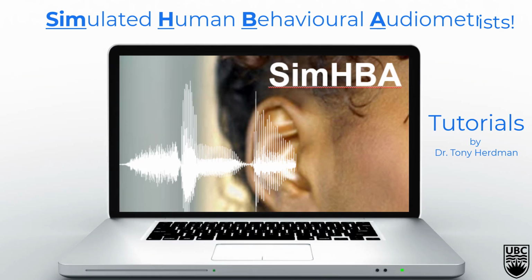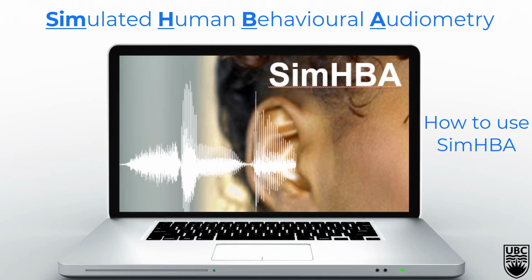Welcome to SimHBA, the Simulated Human Behavioral Audiometry software. In this tutorial, we're going to learn how to use SimHBA, so let's get started.